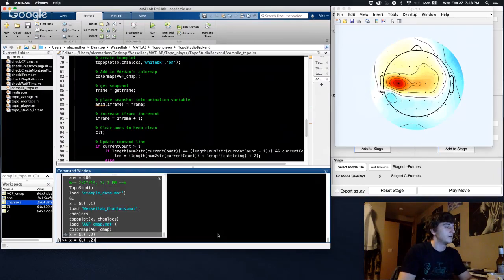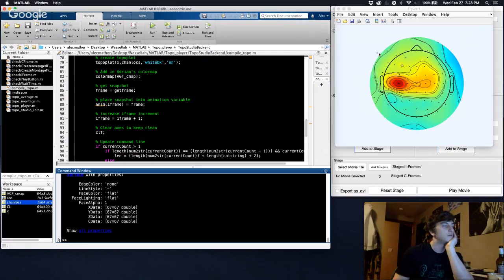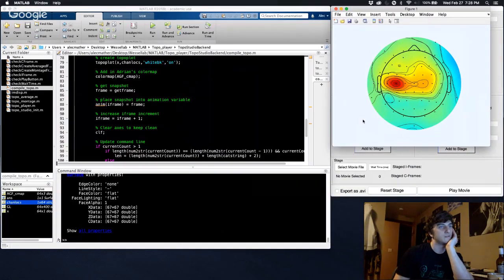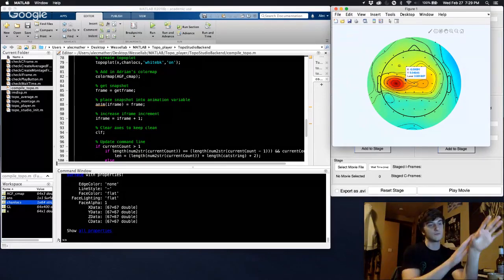So if we extract the second frame, now that is the second frame, and we can see it's a little bit different. Actually, we needed to plot it on a new figure, and we needed to clear it first, but it's a slightly different image, and you can still see the contours from the first image. Like this contour right here is from the first image, and this slightly wider contour is from the new image. So they're actually on top of each other right now.